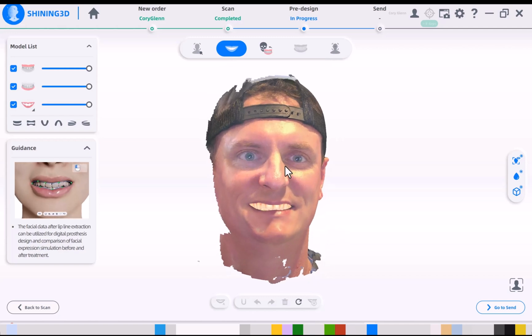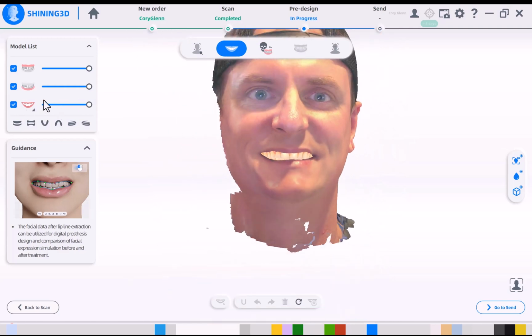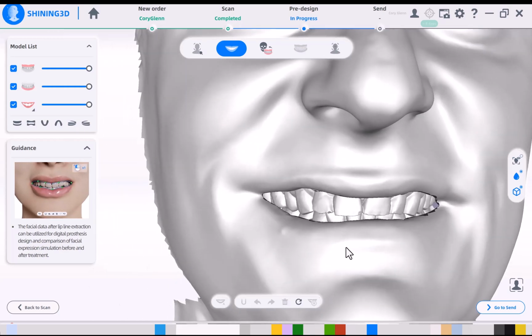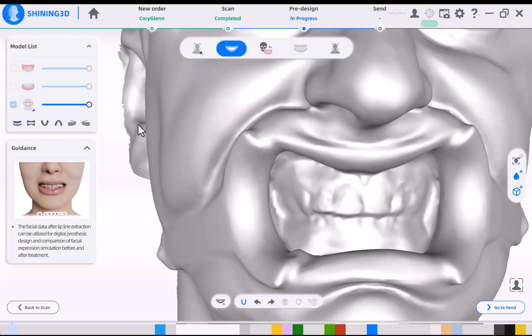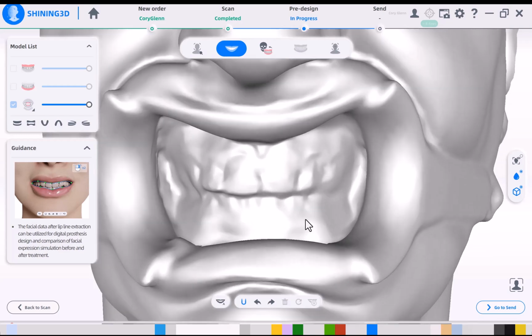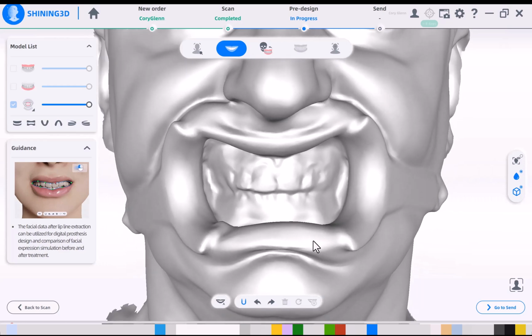And now you can see my natural teeth from the intraoral scan underneath the facial scans, and we can toggle on any of these that we want to. You can look at the texture of these. So if I were to turn these off, and look here, this is what I mean, high accuracy, low resolution. The resolution there is not sufficient to use Exocad's best fit matching.